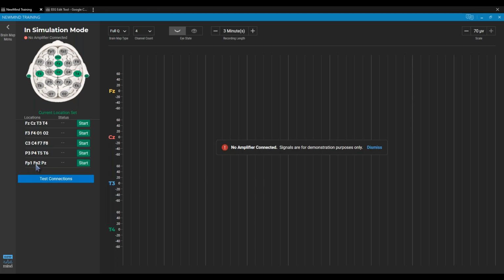In those cases, sometimes I'll still let it go, and I just select that data when I do the edit, because it's just constant through the entire recording. I have 2 choices. I either have to throw all that data away and try to remap them, or I just choose that data, and then when I go look at the map, I ignore those locations.